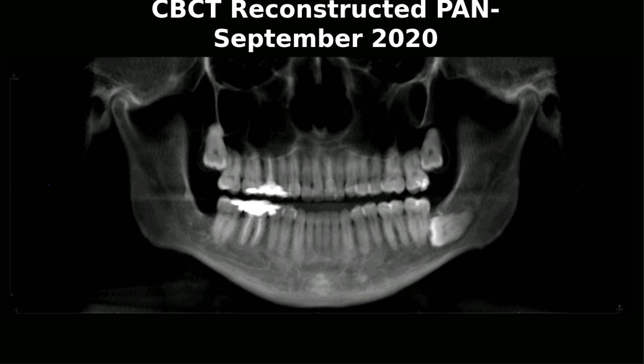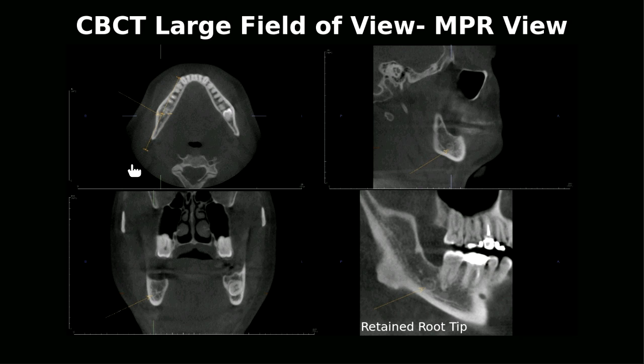So I really checked through this Monday. I went through that area, and I saw there's a branching of the right mandibular canal in the superior direction. The canal goes all the way, and there's a branching of the canal superiorly. I went through the scan and checked. This is called the MPR view, which is the multiplanar reconstruction. Please review your previous slides to know the CBCT views.